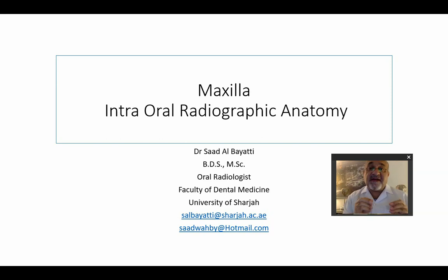They are very important for a basic understanding of radiographic interpretation, because if we fail to recognize the anatomical landmarks, or the superimposition of structures, or the superimposition of soft tissues and air shadows on the radiograph that might mimic the radiographic appearance of structures, we might misinterpret an anatomical entity as a disease.